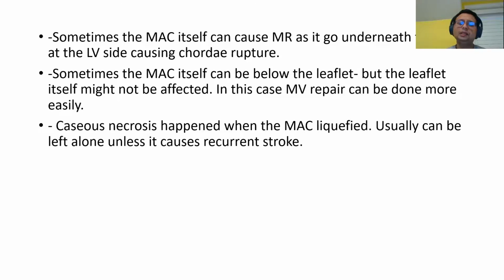What happens sometimes is that the MAC can be liquefied and cause caseous necrosis. This can actually mimic vegetation and can mimic mobile clot, so don't be fooled. So this can be left alone unless it causes recurrent stroke.